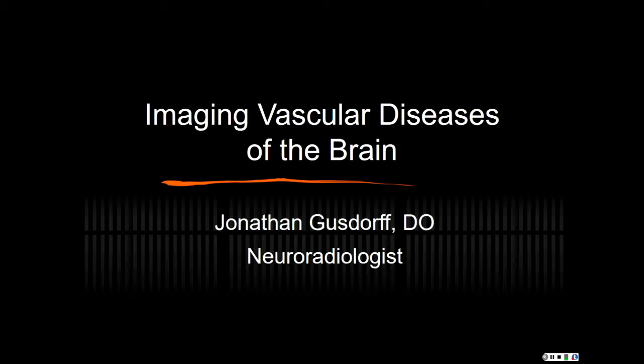On a paired set of images called ADC maps, where you read DWI or diffusion-weighted imaging side by side with ADC maps, if you see an area that is bright on DWI, and that area is dark on the ADC maps, then it is a positive for an acute to early subacute ischemia. It must be bright on diffusion and dark on ADC maps. If it is bright on DWI and bright on ADC maps, it is something we call T2 shine through. It does not represent acute to early subacute ischemia.